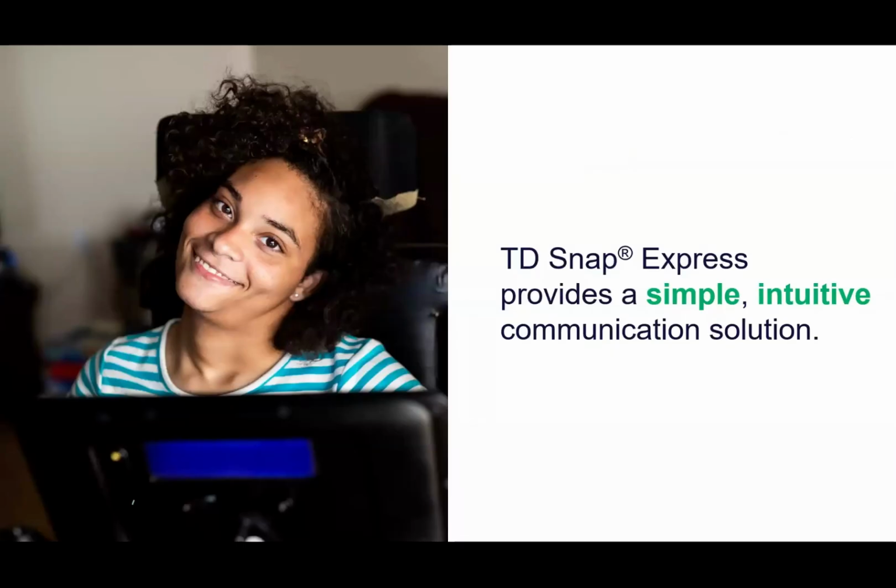All right, and I'm going to wrap this up. So TD Snap Express is designed to provide a very simple, intuitive communication solution. Whether you're just starting out using AAC or if you need a more streamlined approach, it will be an excellent solution for effective communication and opportunities for growth.